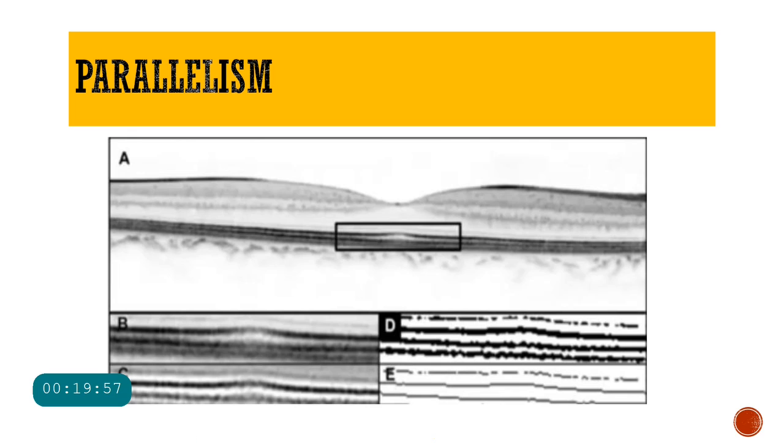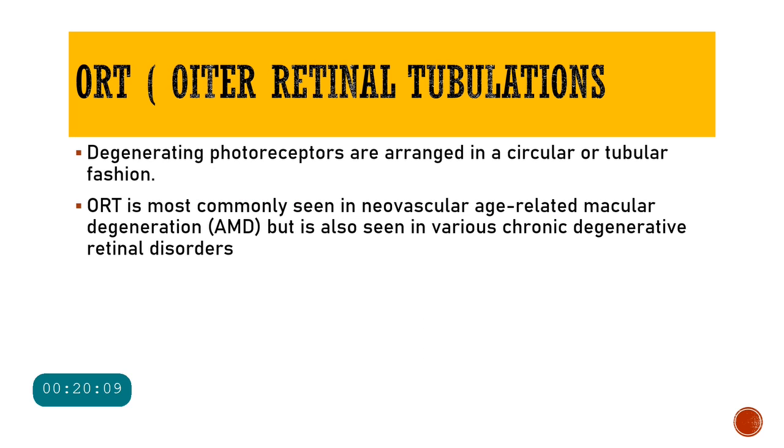Then loss of parallelism. Now, we know that the retinal layers are present in a layered formation, and all these layers are parallel to each other. And if, because of edema, these layers lose their parallel arrangement, that will lead to poor response to treatment.